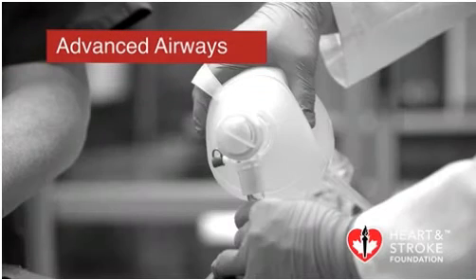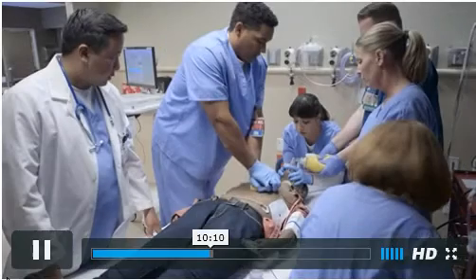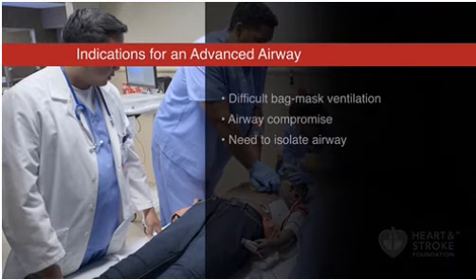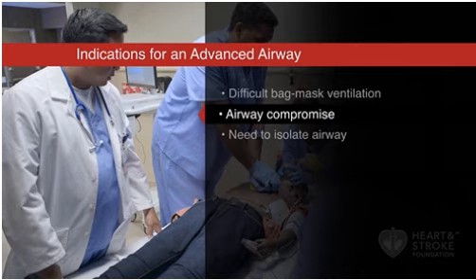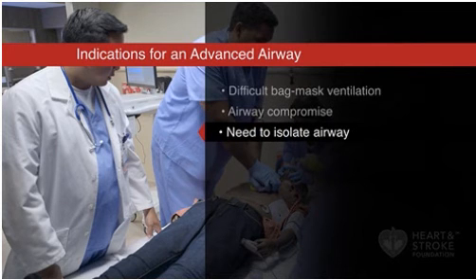When using a bag mask device, whether there are 2 providers delivering breaths or just one, be careful not to press too hard on the mask, which could push the patient's jaw down and obstruct the airway. There are several possible indications for insertion of an advanced airway. These include difficulty providing effective bag mask ventilation, patients with actual or potential airway compromise, particularly with long transport times, or the need to isolate the airway.